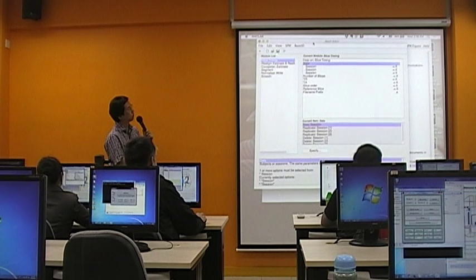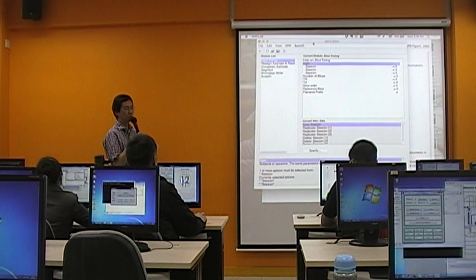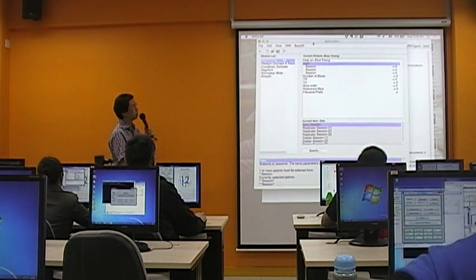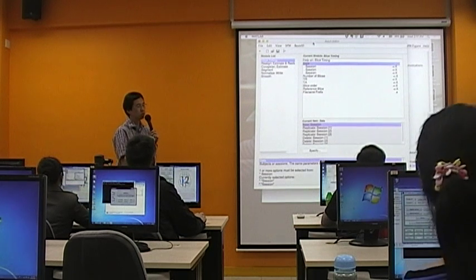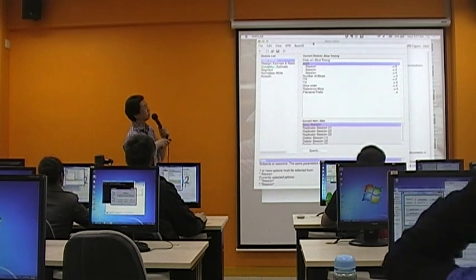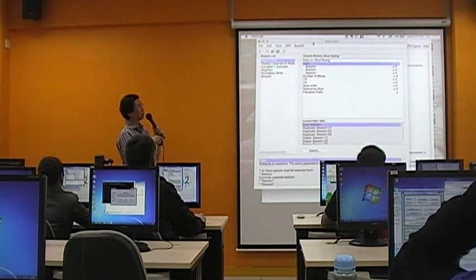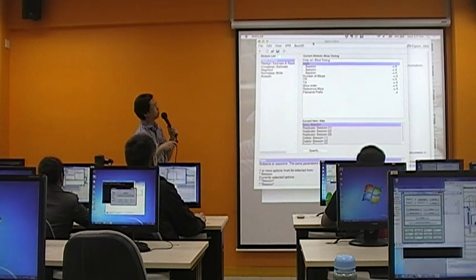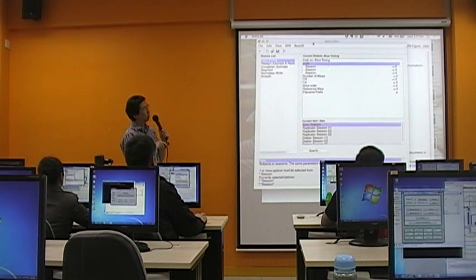First of all, we've done slice timing, if you remember, which I think is optional for you if you have some data, depending on the research question. But I normally don't do that. I don't want an extra step of interpolation. So normally I don't do slice timing, but as a demonstration I put it here. So you need to remember that maybe you don't need to do it. And then for slice timing, there are different things you need to set. And remember for our sample data set.